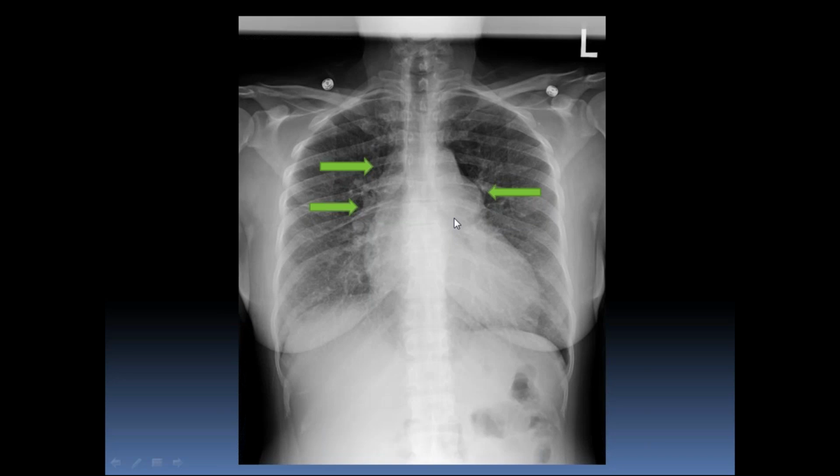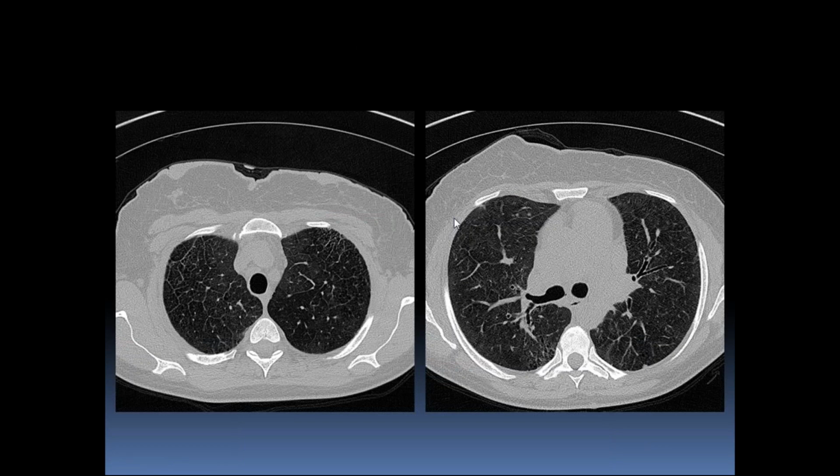So moving into the HRCT. So now, this is just a little board tip on this one. If you want to show a little bit of competence and confidence to your examiner, you can say that this is an HRCT in the prone position. Why would I say it's in the prone position? Because look at where the gantry is. I flip these images so the gantry is actually above the patient, so you know that this is actually a prone patient because you can't image him any other way with the gantry there.